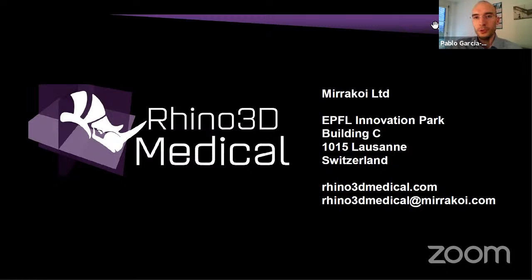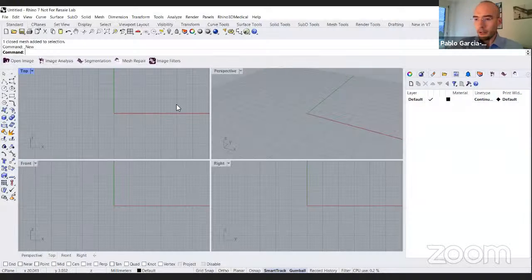Okay, so now I'm going to stop sharing this, and I'm going to share Rhino 7. Moment. To share. Okay, so I have around 30 minutes. So I'm going to show you a case where I create an anatomical model of a spine.